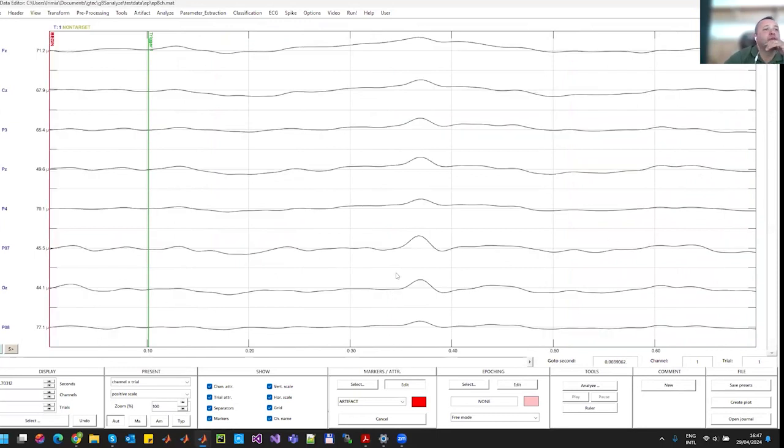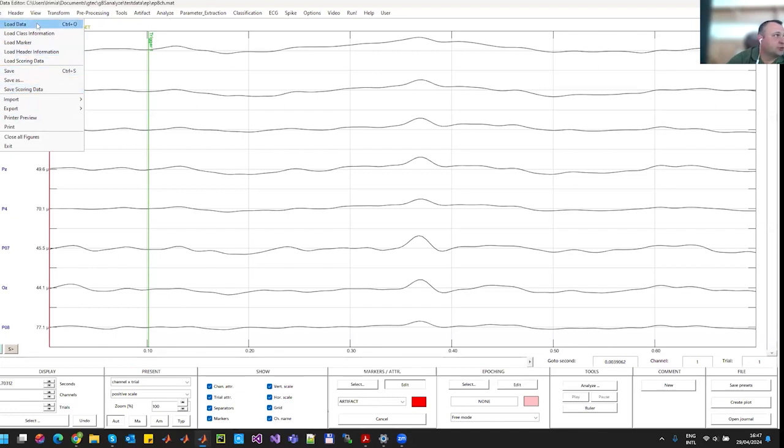Of course, the triggering part has also some other options. We could also line up some trials if we have a raw data set that we want to process. Let's say we don't have markers in it, we can split it into different epochs. So I will import again the same data set.